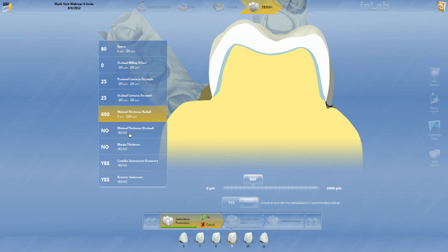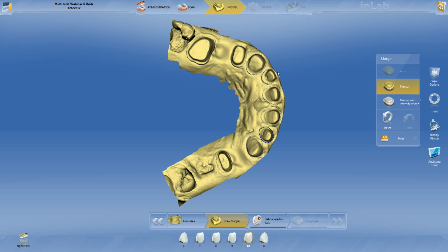I almost clicked OK. If I would have clicked OK, all of those would have just proposed and not the last two.